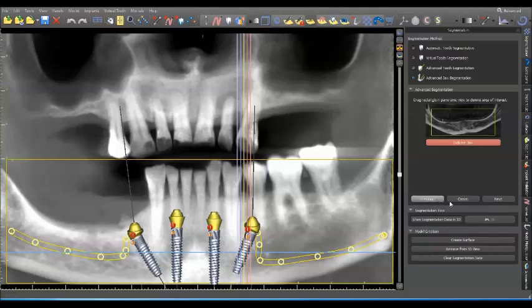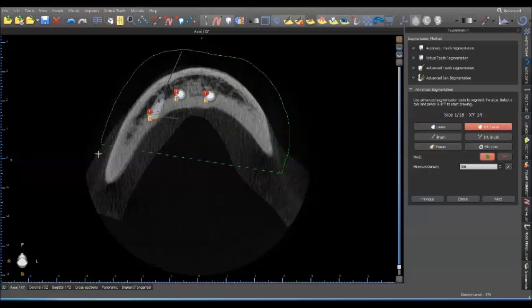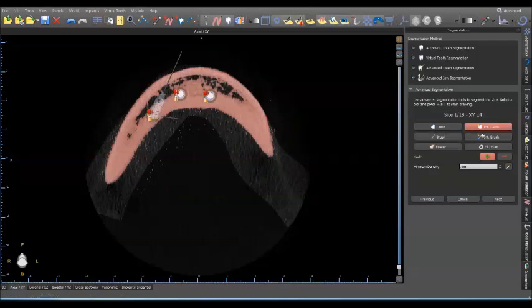And then we'll click next. This is going to take some time to think, and essentially I'm going to speed through this whole entire process, but let you watch what I'm doing. I'm going to press Intelligent Lasso, hold down the shift key, circle the area that I want to highlight, and let the computer think for a little bit. And then what we do is press fill holes, right? And I'm going to continue on.